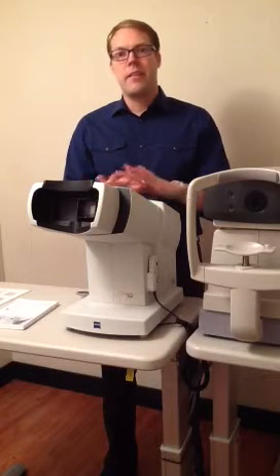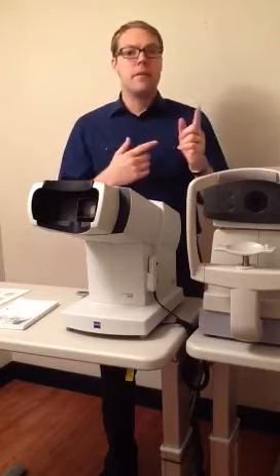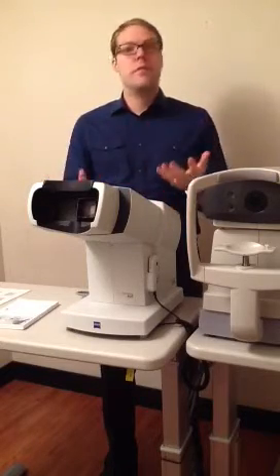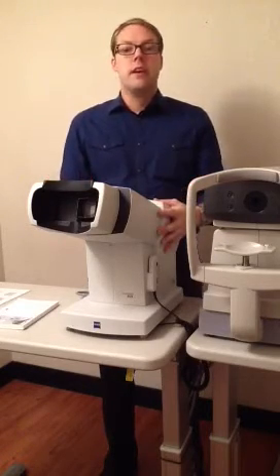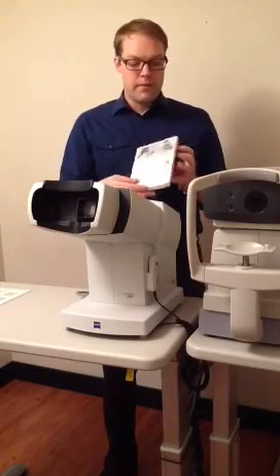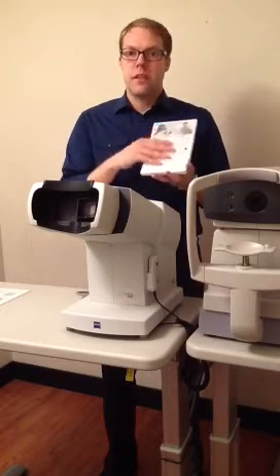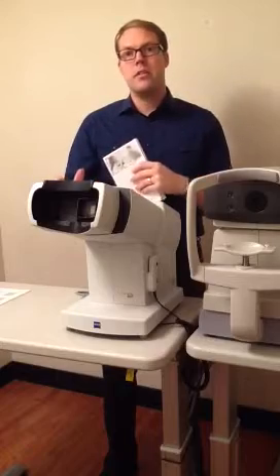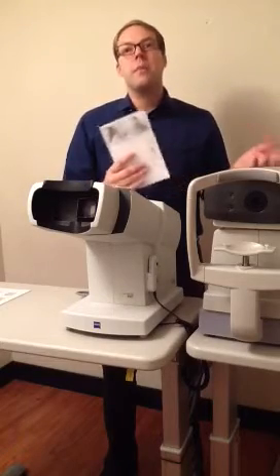Now, let's talk about that visual field script and why it can be very successful. And let's start at the very top. The very first thing we do is say, this is the visual field test. And notice that when I do that, I am gesturing to the machine. I point that out, and it seems very basic, but I point that out because I've seen a lot of stores and VA techs, optometric technicians, that will gesture to the actual selection page rather than the machine itself. This is the visual field test, but this isn't the test. This machine is what does the test. So that's important. We just want to eliminate confusion for your customers who are hearing this for the first time as much as possible.